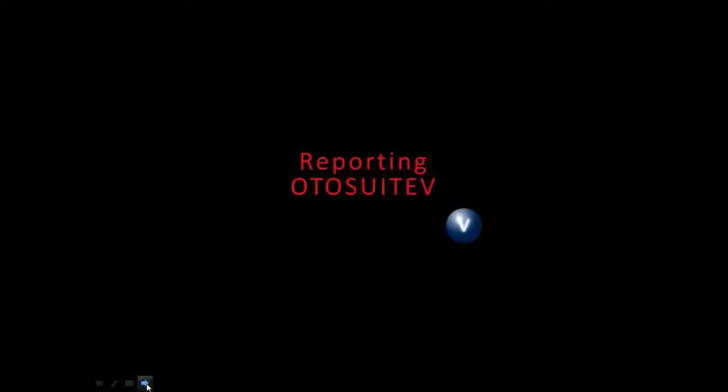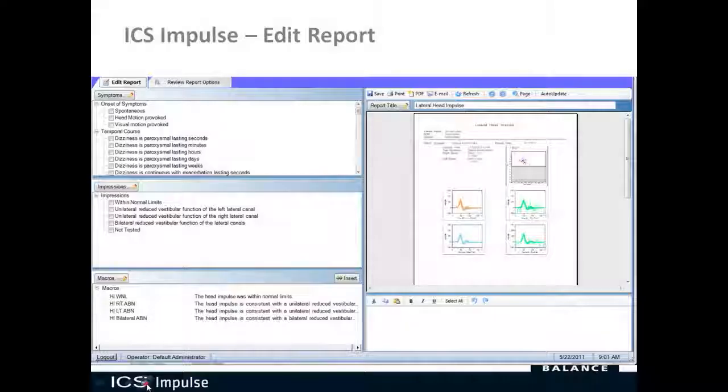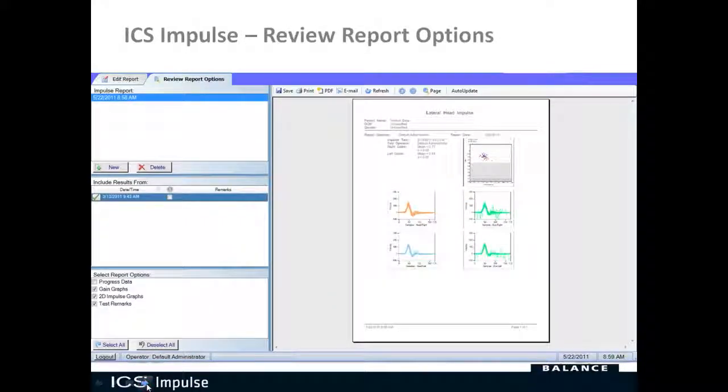This ICS Impulse video is going to talk about Otosuite Vestibular reporting of the data. So the first thing we're going to talk about is editing the report, and then we'll talk about review report options. So let's go into the software.